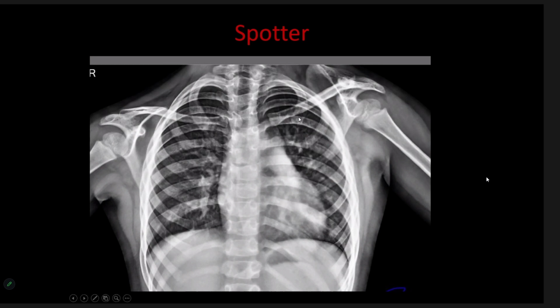Yes, this is Sprengel shoulder. Here we can see a high placed scapula, which is dysplastic. We can have a bone, or part of a bone, connecting between the vertebral body and this scapula, which is called an omovertebral bone. So this is Sprengel shoulder.